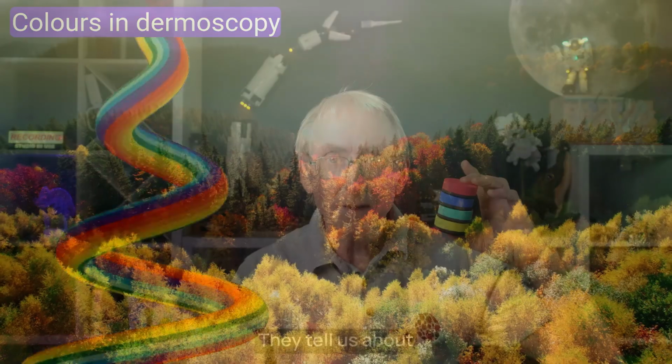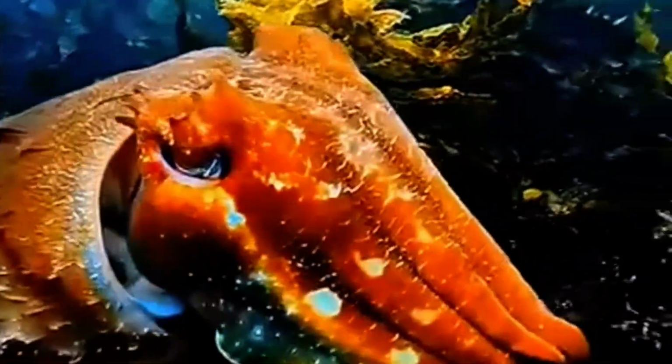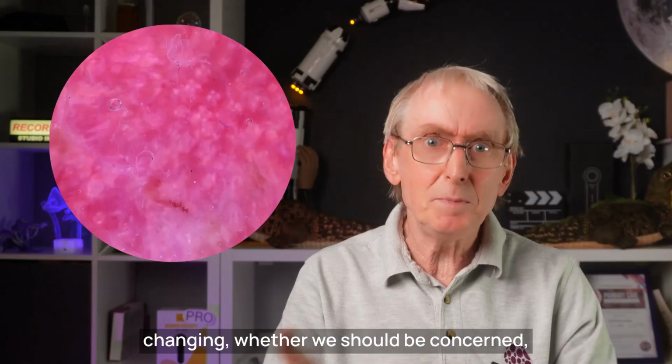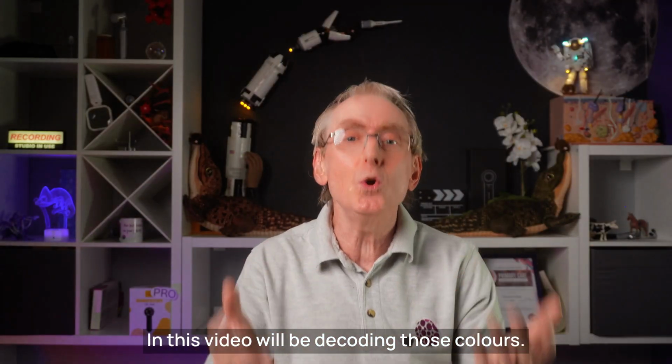Colours. They tell us about the changing seasons, whether someone is interested in us or not, and even if we're feeling angry. In dermoscopy, colours are just as informative. They'll help us understand how the skin is changing, whether we should be concerned, and if those changes are good or bad. In this video, we'll be decoding those colours.